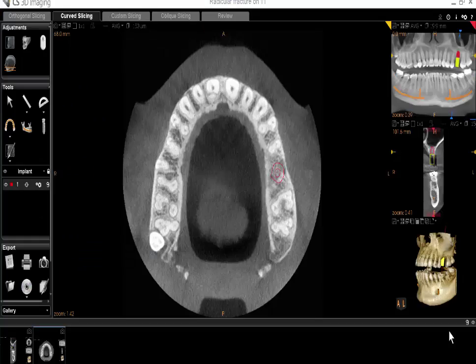There is one final variation on this method with an important distinction. You may have noticed that with my previous screenshots, they were composite images of the entire workspace on my screen, including the thumbnail reference images to the right of the single image. If you would prefer not to include the reference thumbnails, there is another option. In the upper left-hand corner of any single image, you will notice an icon which is a picture showing either a camera or an old-style floppy disk. This icon has a drop-down arrow next to it.